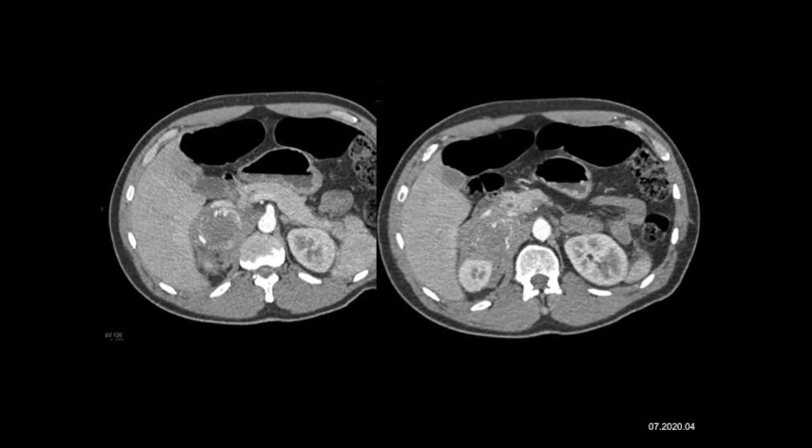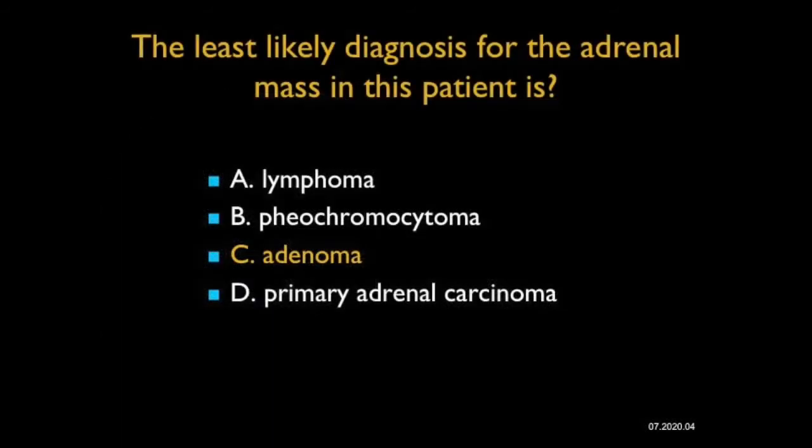But what about something like lymphoma involving the peri and pararenal spaces? Well, you could also consider an angiomyolipoma, perhaps, because maybe it was a renal tumor that bled. Well, what are we really dealing with? Well, I remember I said least likely. It could be a lymphoma with perirenal spread. It could be a pheo that bled. It could be an adrenal carcinoma that spread and bled. The one thing is not an adenoma.